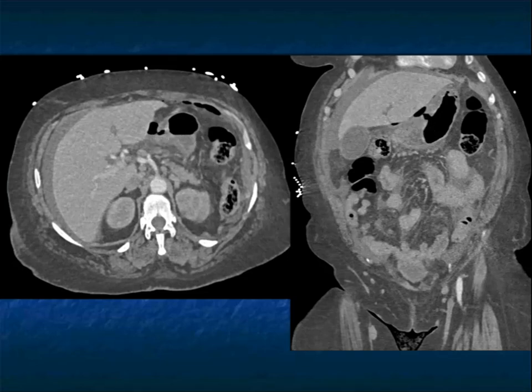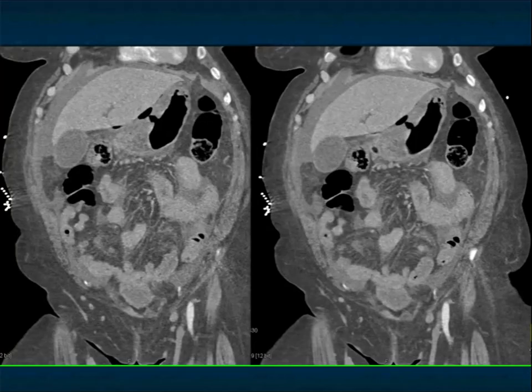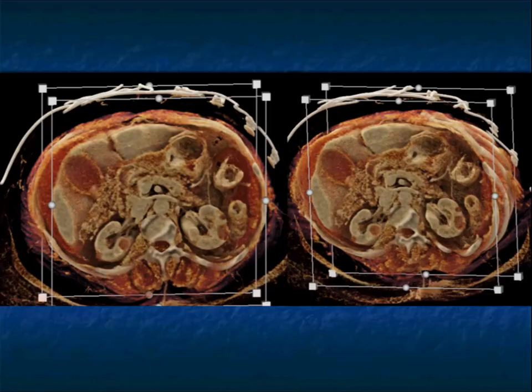Again, the stomach, it maybe could be better distended, but that's the best the patient can do. But you can still see, particularly when you look at the coronal views, very nicely that perforation, really a classic example of a perforation with ulceration and concern for malignancy.